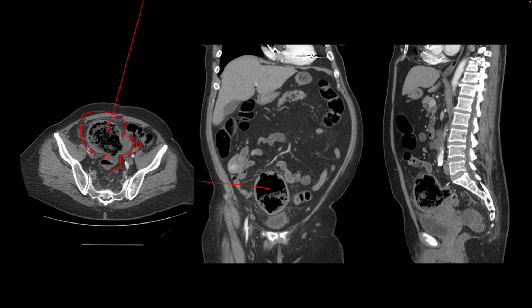And so this patient underwent surgery. This turned out to be contained perforation from diverticulitis, and this low density in the presacral region turned out to be a mucinous rectal cancer. So the rectal cancer was causing obstruction. More proximally, there were more stools and gas in the colon, like we see here, and they had developed diverticulitis, which perforated and caused this large contained collection of fecal material and gas, and that was the cause of their symptoms.